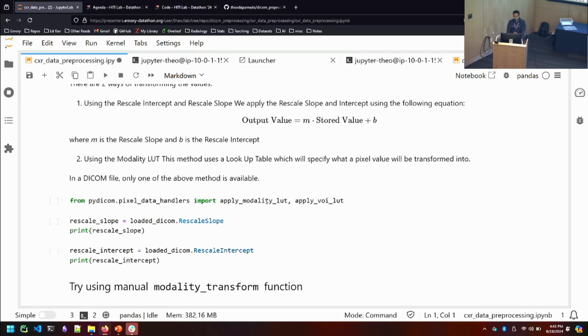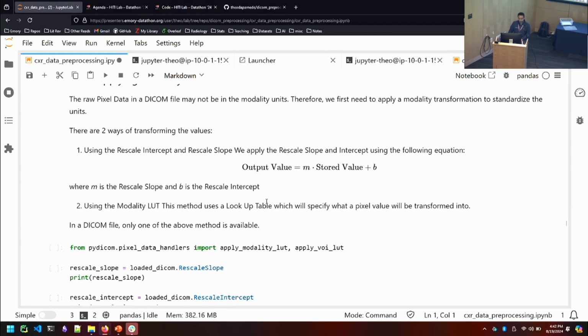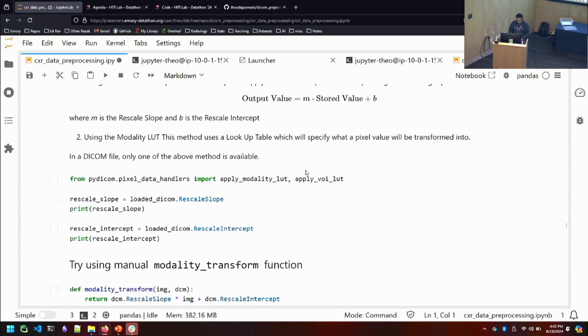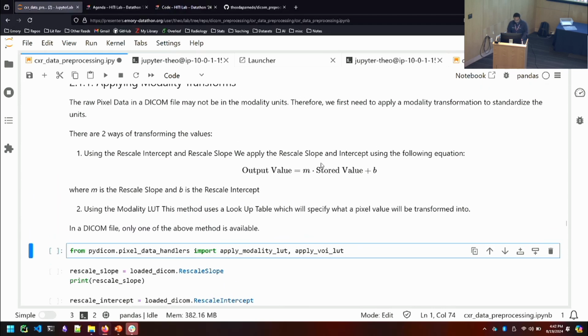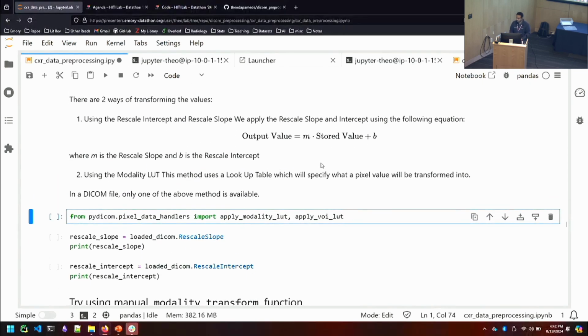The clue for that exercise is that the bit size will be in the metadata. Someone just has to go back to the metadata. You can take a look at the metadata tags and see if there's anything that might represent the bit depth of the image. Alternatively, you can look at the min and max range of the pixel array. If the maximum pixel intensity is 60,000, then you can't have a 12-bit image, because 12-bit doesn't go that high.